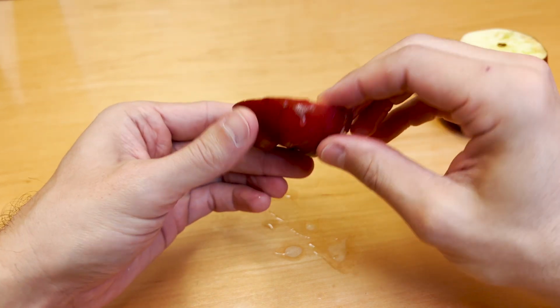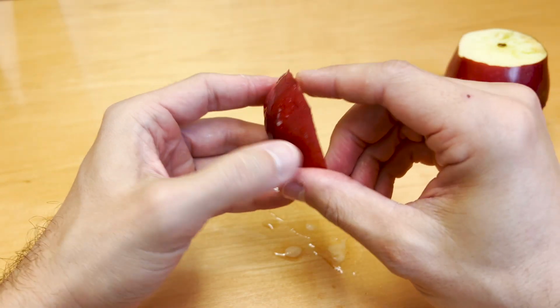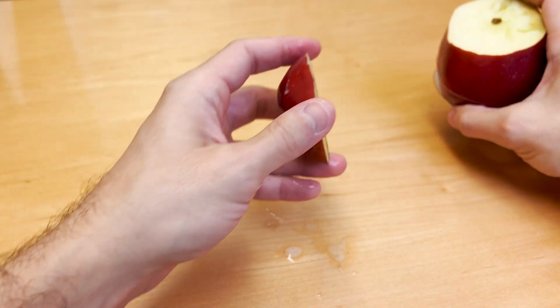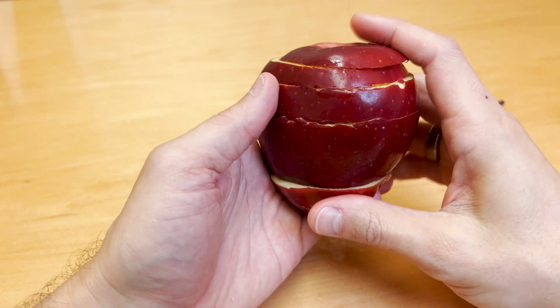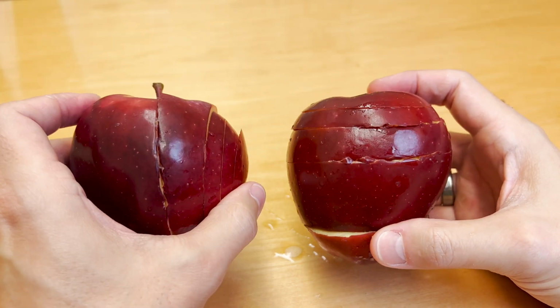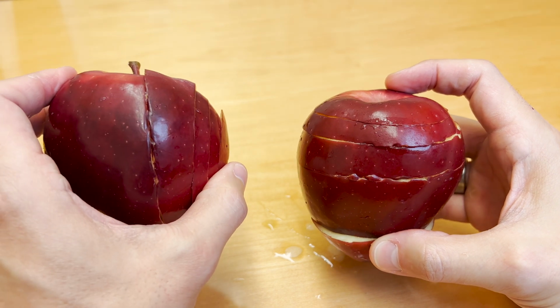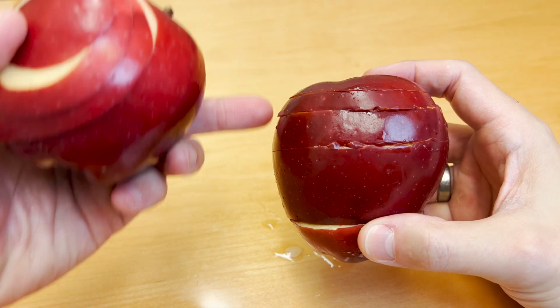And if we made a cut just through the bumps, we might actually just see a bunch of little bumps on the apple if we cut it right on the very edge right there. And so that's how the MRI produces or would produce images through a simple object. So you can see how the different cuts, the orientation is different on the apple on the left. The cuts are more up and down, and then the apple on the right, the cuts move from top to bottom.